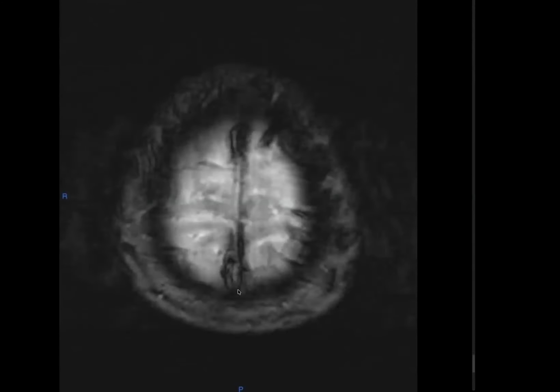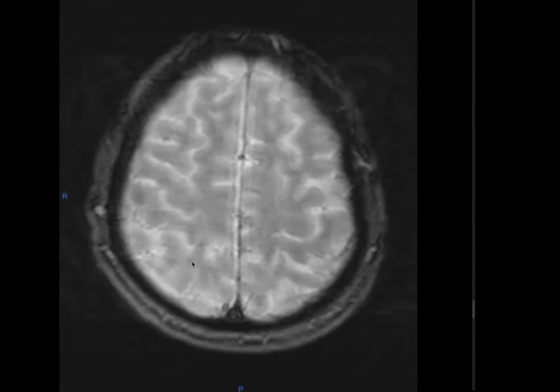But yeah, this was a case of some dural thrombus as well as superior sagittal thrombus. You can see it here. This is the superior sagittal sinus thrombosis. And once you reach the diagnosis, you know how to manage it, flag it immediately, say, call the team, let them know. The rest is not really important. You can just, as long as you flag it and tell them I've informed the clinical team.